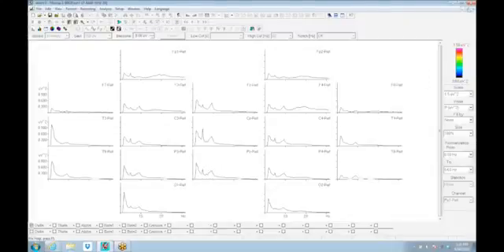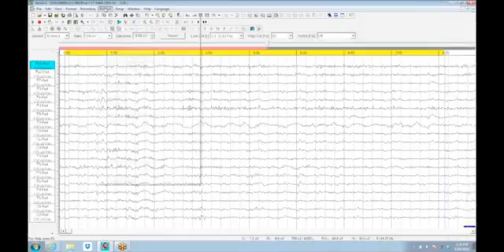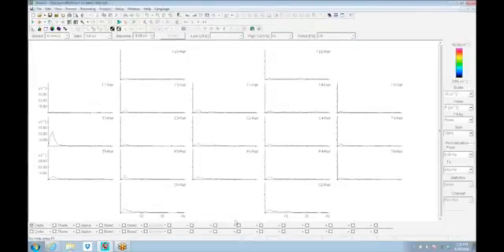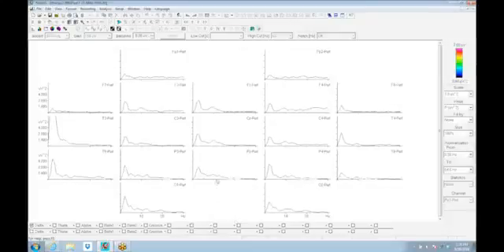If I turn down the sensitivity by going back to this 1-second epoch length, which is again the typical resolution, I don't have that resolution anymore. Where's that nice narrow little spectral peak that was in there? So you lose quite a bit of resolution by dropping to 1 hertz.